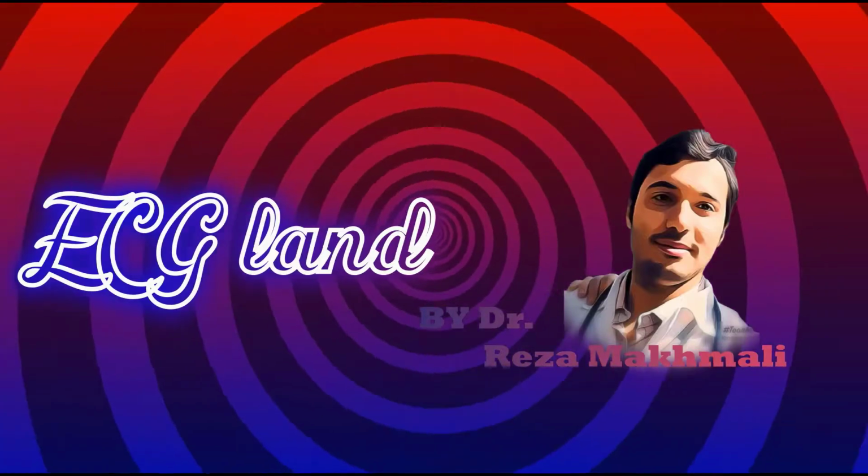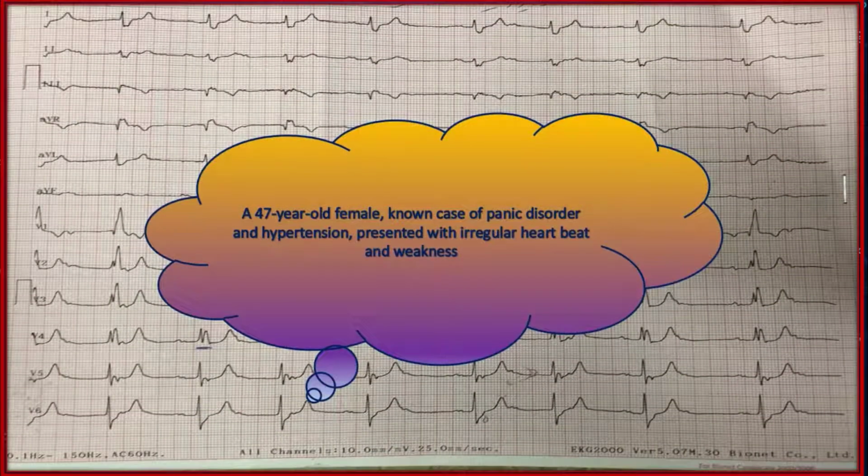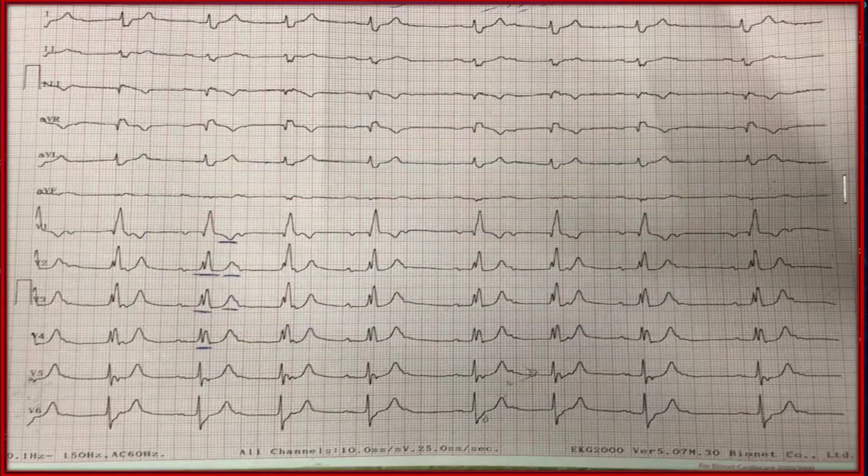Let's go through today's challenge. This EKG belongs to a 47-year-old female, known case of panic disorder and hypertension, presented with irregular heartbeat and weakness. In physical examination, her heartbeat is obviously irregular. An EKG is obtained. What do you think about the underlying cardiac rhythm? Does it require any immediate medical intervention?